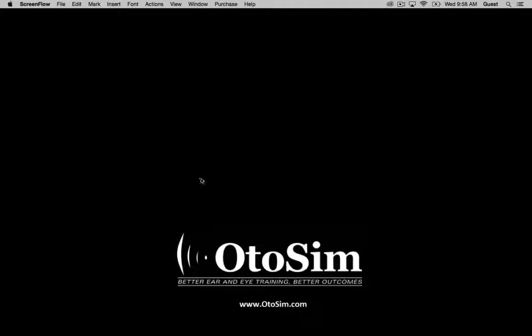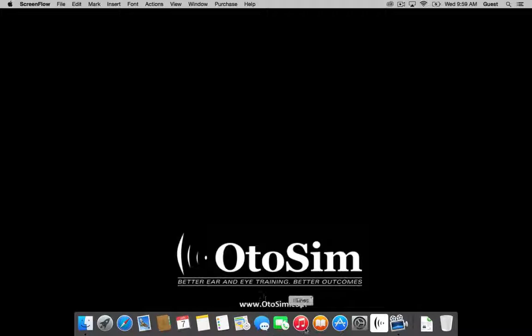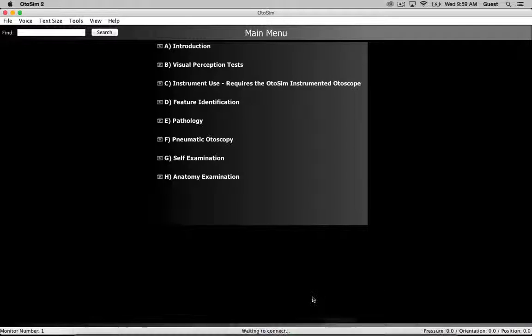So right now on the screen, you will see our logo, and I'm going to open up the OtoSim 2 software, which is in your applications folder at the bottom. OtoSim 2, click, and this is our splash screen. And we'll go over this program in fairly detailed fashion to show you some of the features that are different from our previous version, and also explain some of the importance of our newest additions.